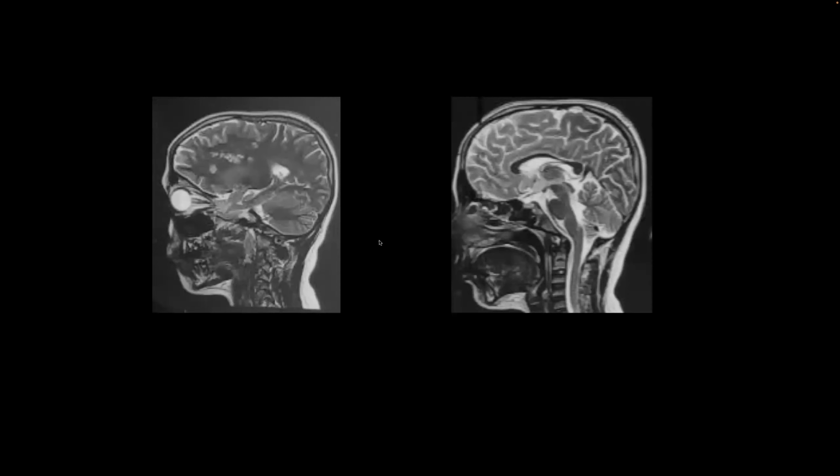On the sagittal images, slightly pixelated again, but you can appreciate the volume loss of the supratentorial structures, thinning of the corpus callosum. The corpus callosum itself is spared in terms of the lesions, and you can appreciate the periventricular white matter changes on the sagittal images over there.